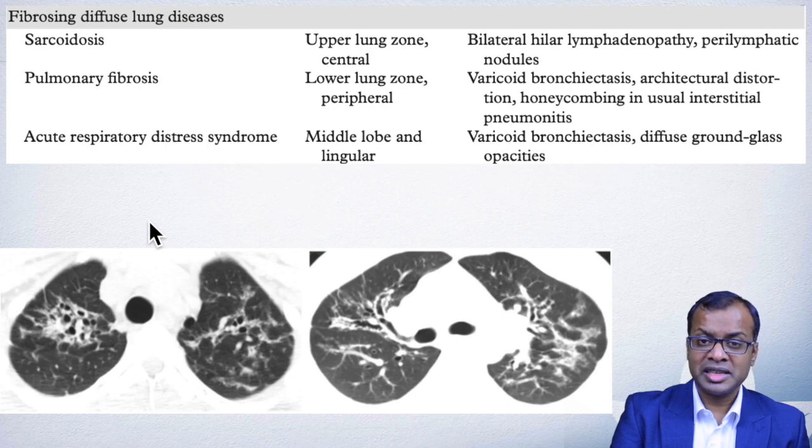Pulmonary fibrosis as part of interstitial lung disease will also give you bronchiectasis, but that would be of a traction bronchiectasis nature rather than a simple bronchiectasis. The last group we look at is that post-recovery from ARDS can also lead to bronchiectasis.